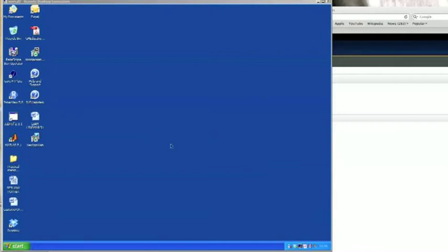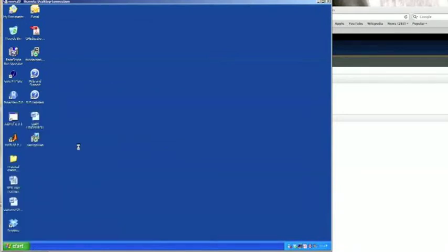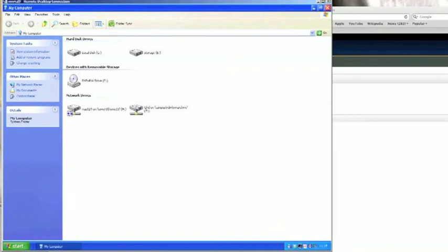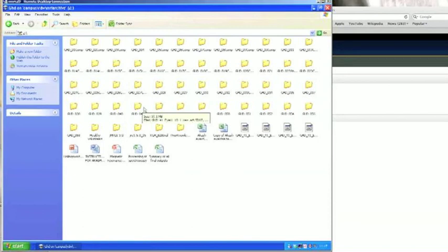Okay, so this is how to process the JMRUI software. This is based at the MR Centre at Newcastle Hospital, Newcastle University. I'd like to thank Dr. Kieran Hollingworth for teaching me how to do this.